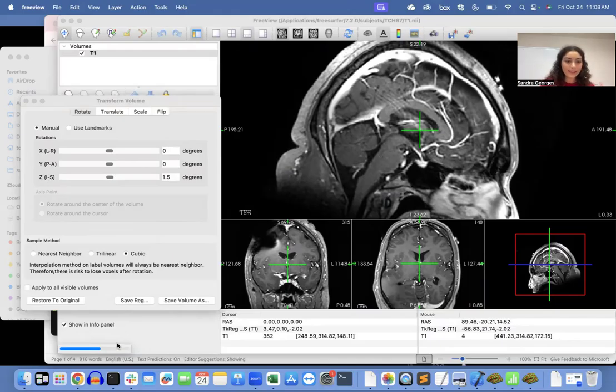So once this saves out, I'm going to load our CT that we've taken as well from the raw imaging and manipulate that in the same way where I transform the volume and make sure that the eyes are in line, the head and the bones and the anatomy in general look like they're pretty much in the right spot. So I'll show you how to do that, and that will be the end of what we do in FreeSurfer. And then there is a little bit of code which we have written out in our OneDrive document. And then that will allow us to prepare and get the recon started.